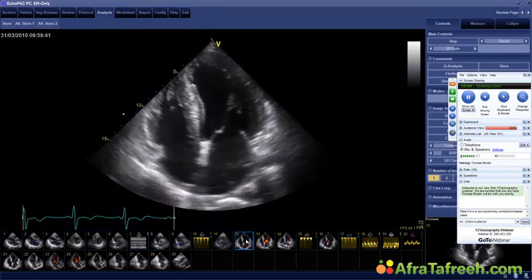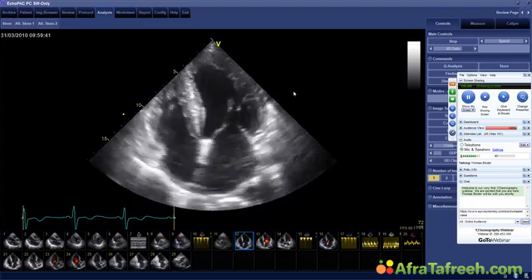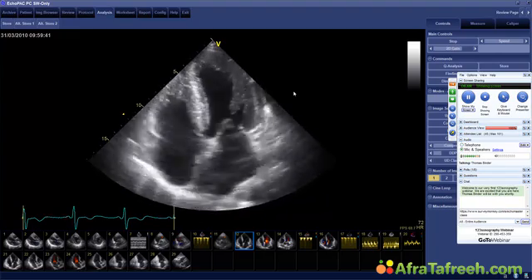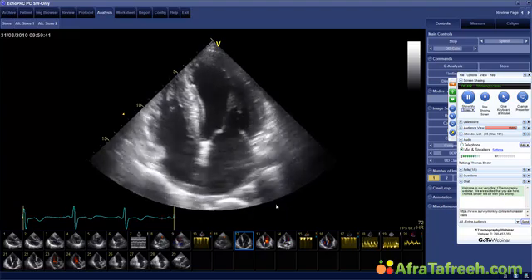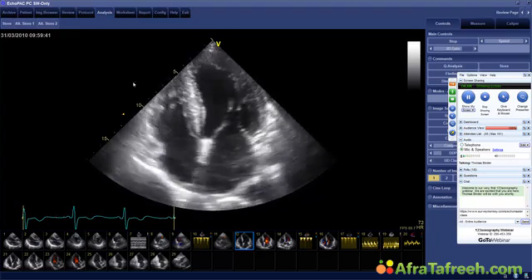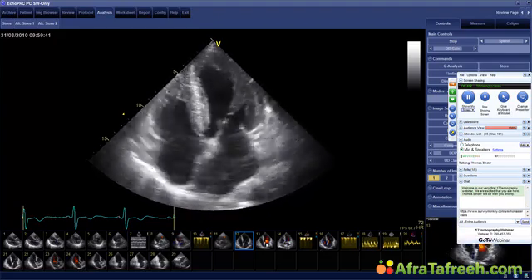Now let's turn to the apical views, the 4-chamber view. Now keep in mind, the patient presented with chest pain. So this was his initial presentation. And in the back of your mind now, try to make up your thoughts, what it could be, and which potential differential diagnoses you would expect in such a patient. Look at the heart chambers, especially the left ventricle, of course, left ventricular function, and particularly of regional wall motion.